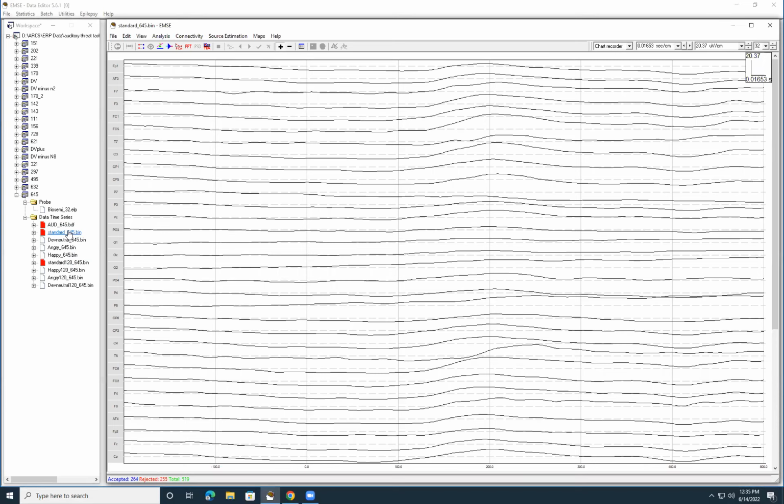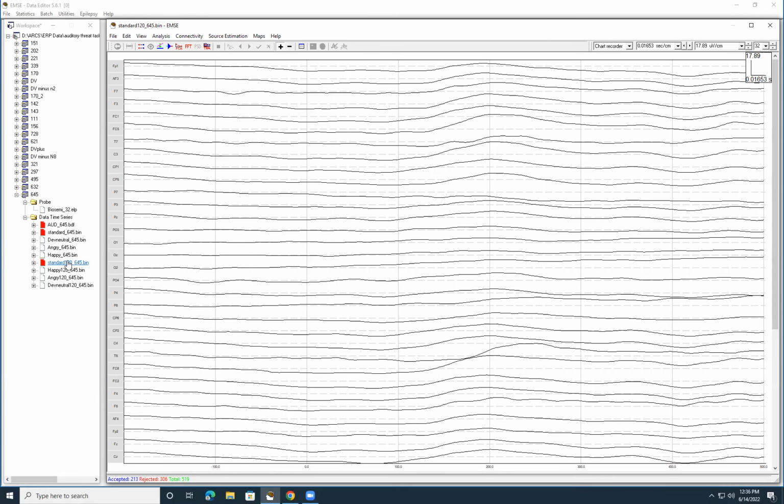And so for the beginning of the auditory threat study early on, we were having the kids come in and they were sitting so still and we were getting so many trials that we thought, hey, maybe we can get away with being really picky about which ones we allow in here. And sometimes there's almost no difference in the number of trials between the 140 and 120 because the kids are sitting so still that you're not seeing huge fluctuations in the signal or even small fluctuations in the signal. But 120 is definitely going to be a little bit pickier and more sensitive than the 140. And then for a case like this that we just processed where we did see plenty of noisiness, you can see how these different filters make a big difference.